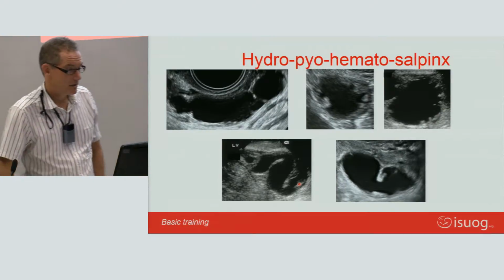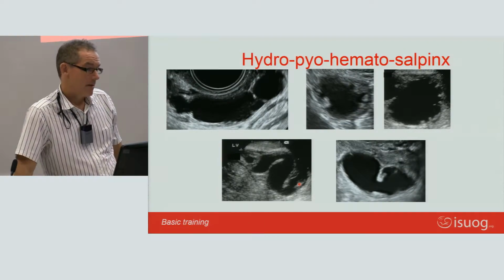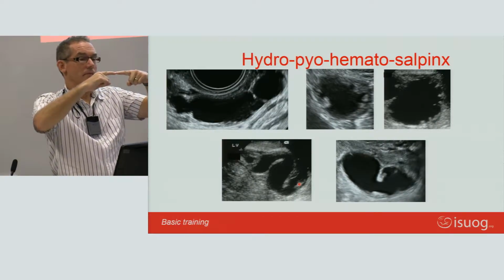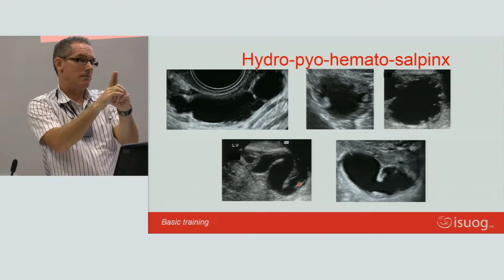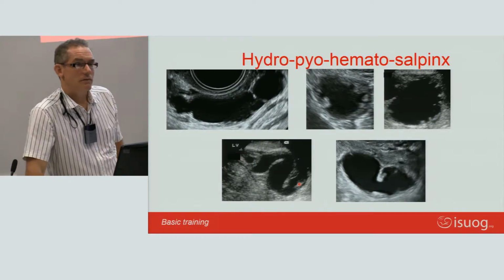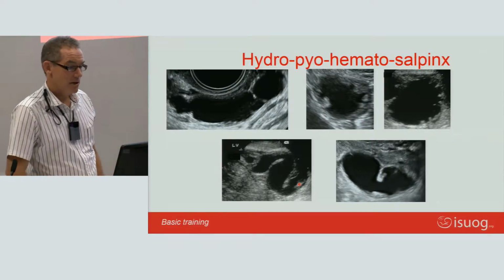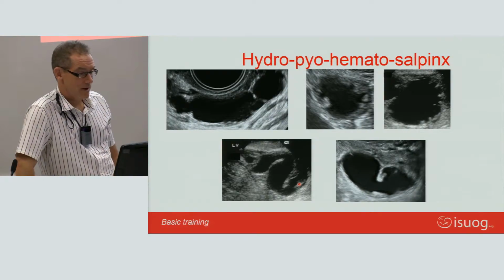So how do you diagnose a hydrosalpinx or pyosalpinx? Essentially, if you're seeing a longitudinal sausage-shaped cyst with incomplete septations, the chances are that is a tubal cyst. You can imagine if you've got a fallopian tube like that and there's an inflammatory process, it basically bends back on itself. So what you're actually seeing is the wall of two parallel tubes, and that's why you have that incomplete septation. Likewise, in cross-section, if it's acute inflammation, then you get inflammation of the mucosa that gives you the cogwheel appearance in that middle slide. With chronicity, you'll get burning out of that inflammation. The mucosa is then destroyed, and then you see the beads on a string appearance, which is the cyst on the far right.